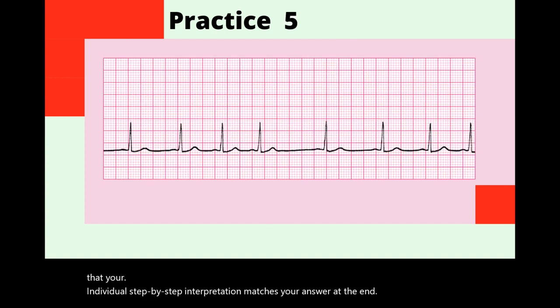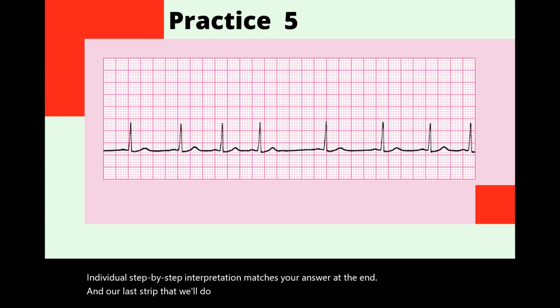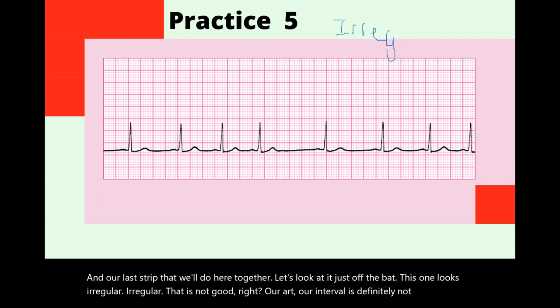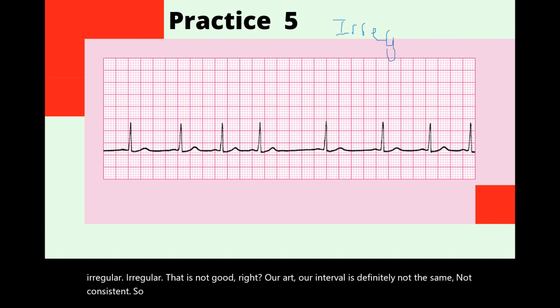And our last strip that we'll do here together, let's look at it just off the bat. This one looks irregular. That is not good, right? Our R to R interval is definitely not the same, not consistent. So that is a red flag for us.